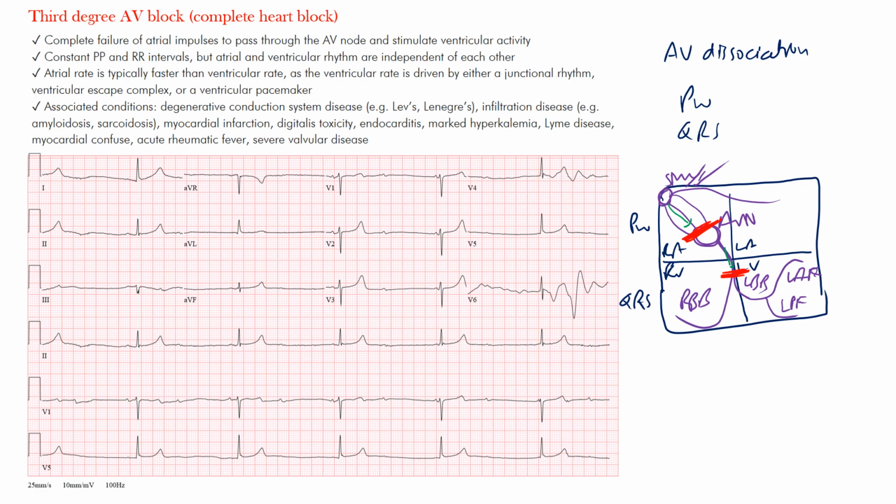And because the ventricles are not getting any signal, they'll start their own impulse, and maybe that starts from somewhere along here, if the block's a little higher, or maybe it starts somewhere in the ventricles and you have maybe a ventricular escape rhythm that takes over. All right, because the ventricles need to conduct and they're using their safety net to keep everything going. And this is what we think of as third degree block.